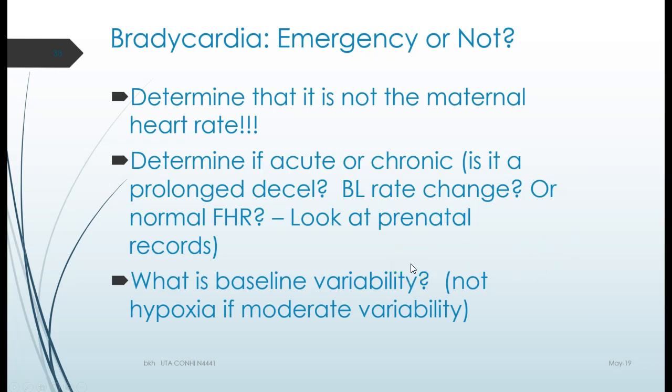We're going to determine if this is an acute or a chronic change. Has this baby been hanging out? Say that it's a 100. And yes, that's just a little bit below 110, but 110 is our cutoff. So anything less than that, if it's hanging out at less than that, that's a concern and has to be evaluated. It's not close enough. It's less than the 110, so we're going to evaluate it. So say this was hanging out at the 100s.